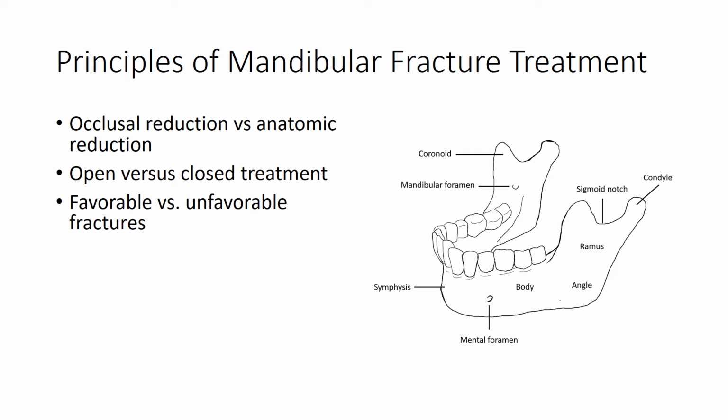So I don't think you should ever include the words favorable or unfavorable fracture in your report, but describing the exact orientation of the fracture can help the surgeon figure out whether or not it's a favorable or unfavorable fracture.